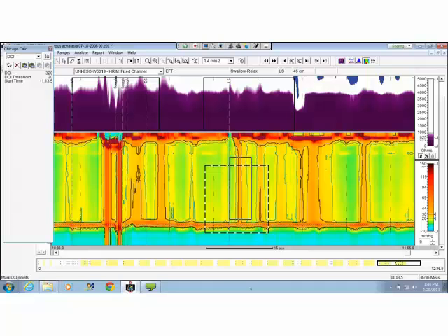And then I would log it. Then I would go down to distal latency, starting at the onset of the UES relaxation, scroll straight up across. Is that where my CDP is? Well, I don't think it's going to matter much whether I measure it there or whether I measured it. This would be too high.